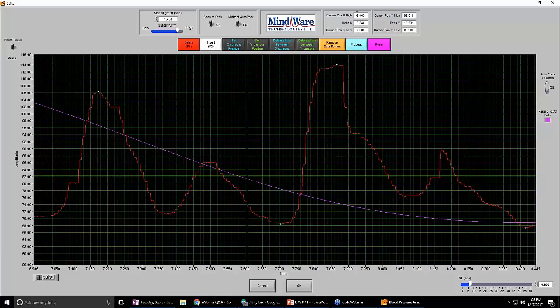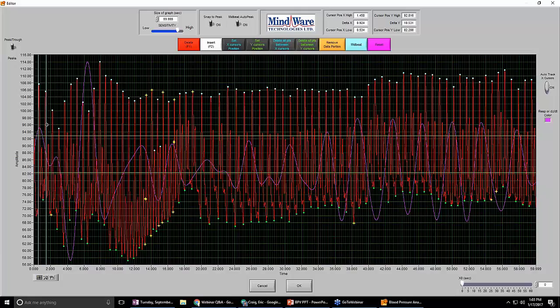Okay, it appears that my number pad is not working, so that's not going to work. But if you did have a functioning keyboard, then you would simply type in the number that you need, and then this other cursor will appear back on the screen. If you didn't do that, then you'd have to back out, go find where that is, move it to the window that you're looking at, and then zoom in from there.